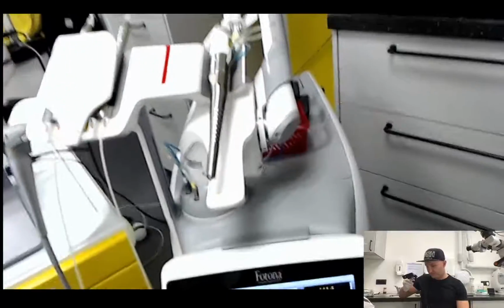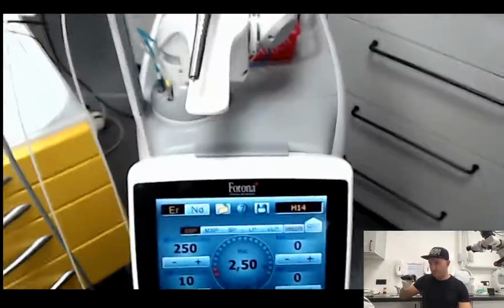Maybe the erbium YAG laser, which we are going to talk about today, is not as dangerous as the YAG laser shown in the previous episode, but still, safety first, and you always have it in the back of your head.